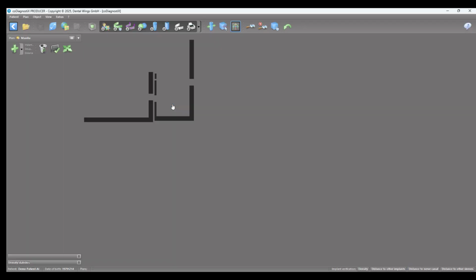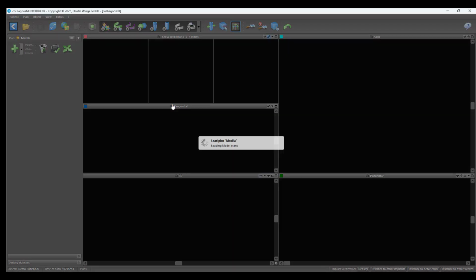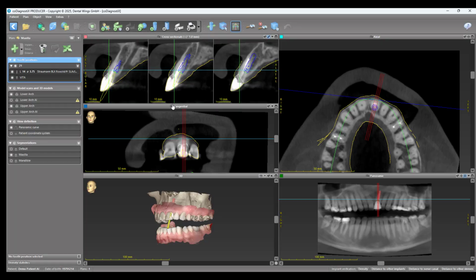The coDiagnostiX user will be able to share the patient order, including DICOM, surface STL file, and the implant positioning with the Smile in a Box team by using this connection. Click on the caseXchange button in the bar at the top to start the connection.